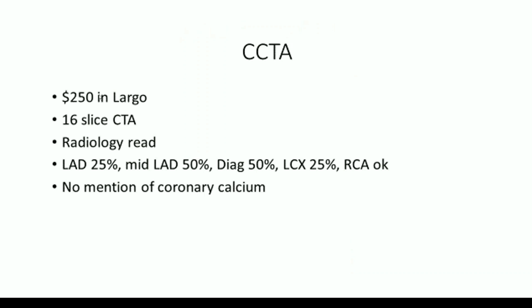It was actually $250 in Largo, a 16 slice scan. Radiology read it as 25% LAD, mid-LAD, they call it 50%. I don't know how you read any of this stuff. No mention of coronary calcification. With an inadequate, non-diagnostic study, you really can't see anything.